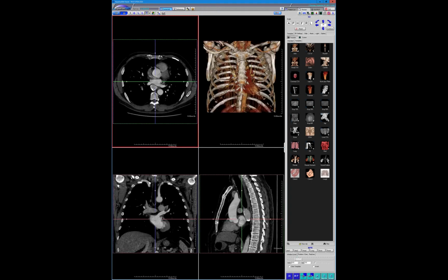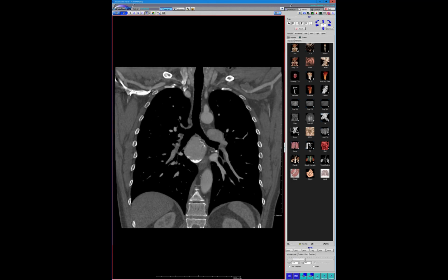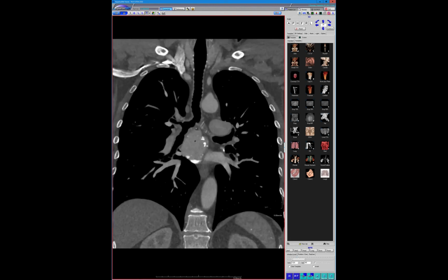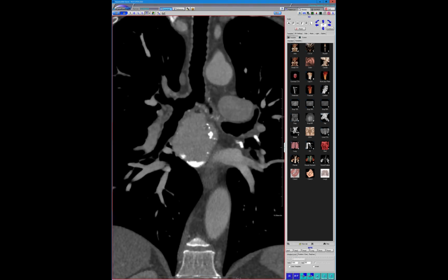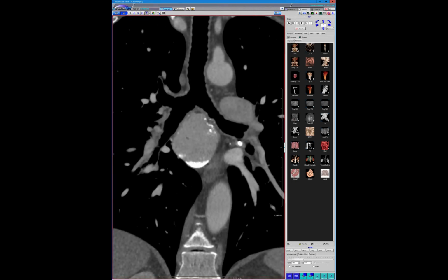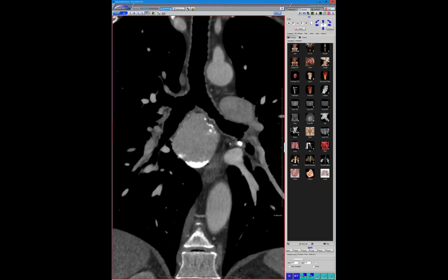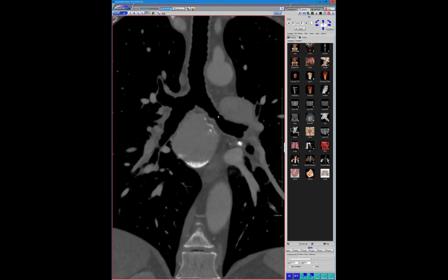Is there a little air in that one too? I think there may be. It was right by the tracheal bifurcation, so let me see. Maybe, oh, there's some, maybe, is that fat? I was gonna say, is that lipid? I don't know. It kind of looks like it, but there's layering milk of calcium. I can't imagine it would be a teratoma, but you're right, there may be a little bit of lipid there. That's odd. I think it's floating. Yeah, I think it's floating too. Oh, wait a minute, it's CT, so it's not floating.